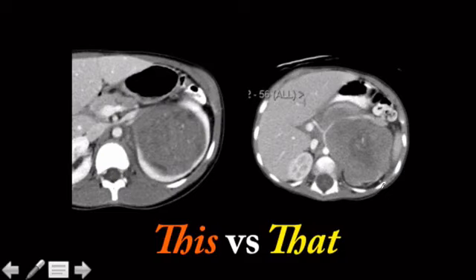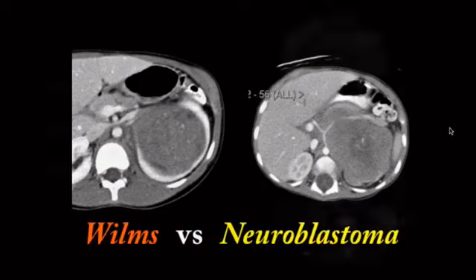You're not going to be able to scroll up and down. That's a gamesmanship tactic. Don't try to say, oh, I don't know, I can see the kidney, maybe it is coming out of the kidney. If they wanted you to know, then they would show it to you. The other thing is the little pieces of calcification in there. This looks like maybe it is wrapping around a vessel. So those are all neuroblastoma features as well.